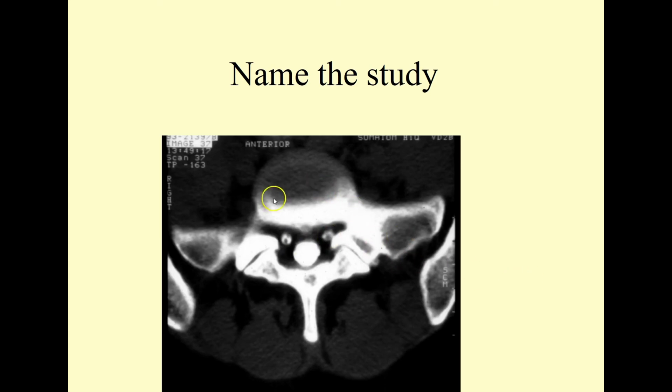And again, this is a bone window, and you can see great bone detail. You know it's a bone window. And even though we have contact here, it really isn't enough ordinarily to cause trouble. But when you factor in the soft tissues that encase this joint filled with fluid, and if this is the result of facet syndrome, they can often get segmental signs and symptoms in the lower extremity. Again, this is a patient that I would not hesitate to offer my services. My expectation would be a good response because there really is plenty of room in the lateral recess. We haven't closed down the central canal into the trefoil shape, so I would expect the patient to recover quite nicely. And as long as I keep them moving, then things should go well for them.